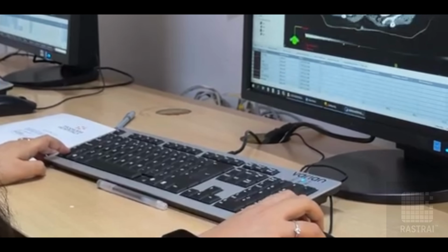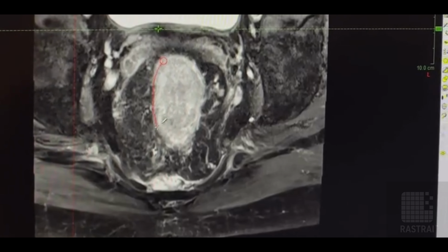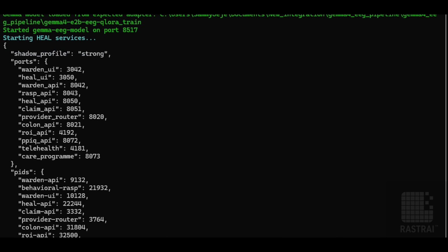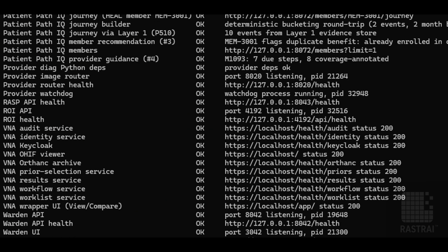Medical imaging workflows often require clinicians to click through image slices, switch between disconnected tools, and generate reports that involve manual contouring, biomarker interpretation, and validation steps. HEA³ by RastrAI brings these steps into a unified clinical imaging workspace.